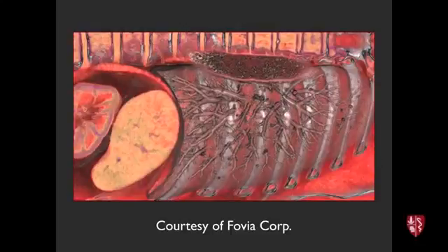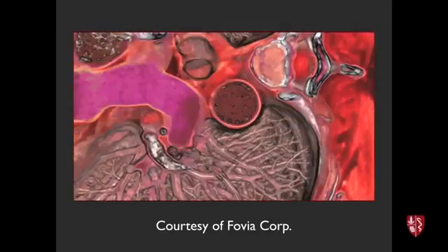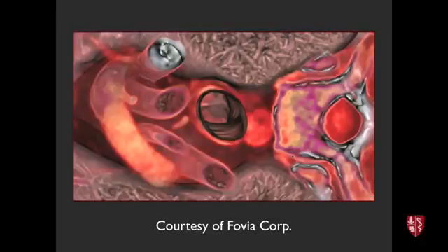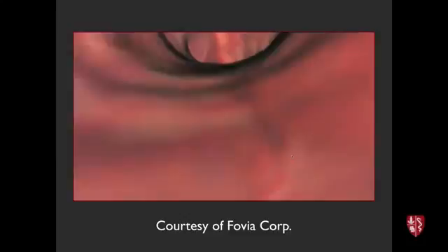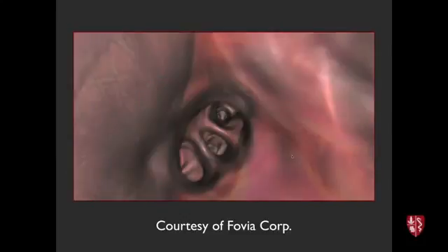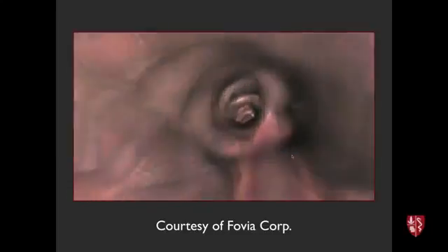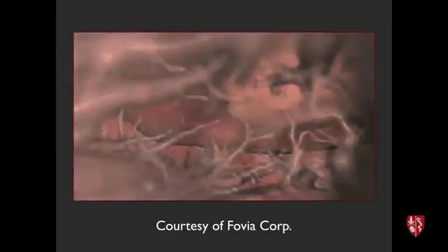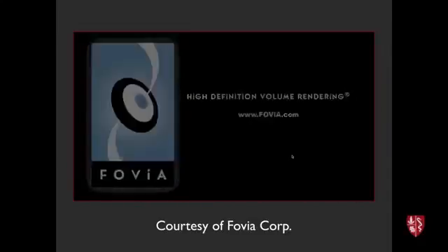And one of the things I worked on a lot in the earlier part of my career was flying into and through data. So in this patient, we're actually going to fly into the trachea here. It's just CT data, but with advanced computer graphics, you can do a virtual endoscopy. And so you can imagine the potential value of this sort of thing in a routine clinical examination, allowing you to see things in ways that were otherwise never possible.